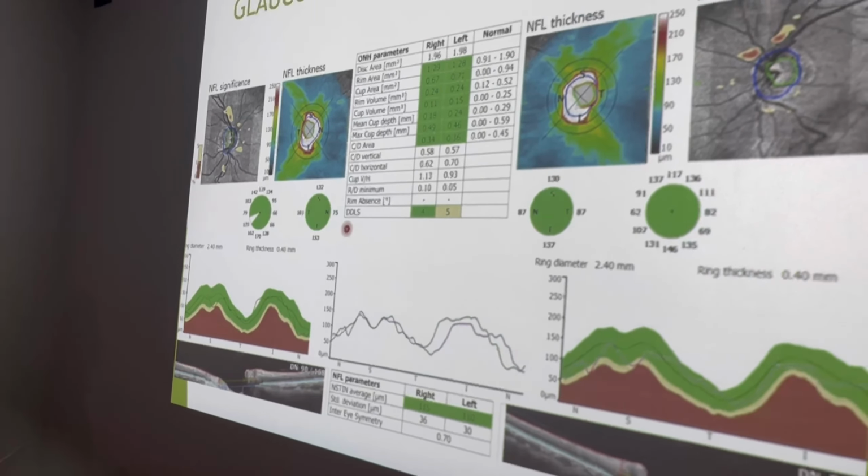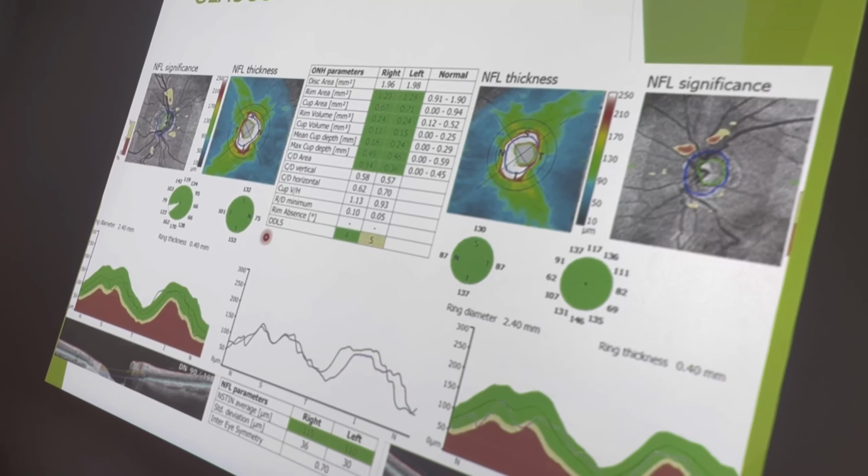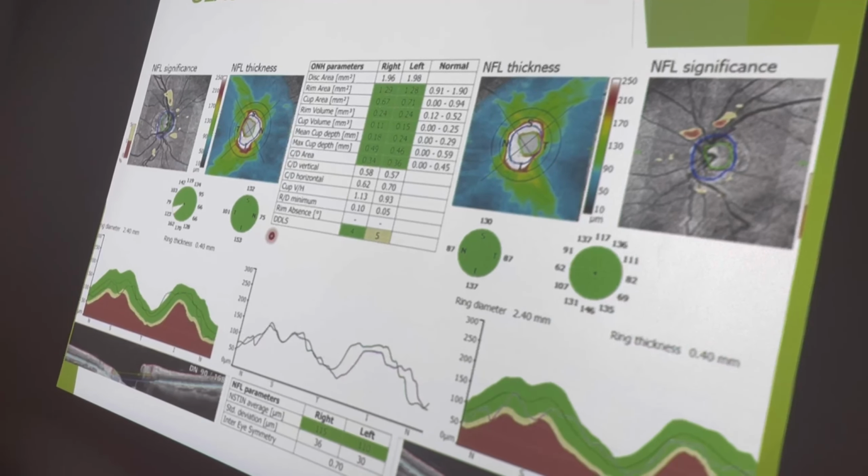In this patient, the patient had high teens IOP, and fields showed some peripheral points but not corresponding to the OCT scan, but the OCT scan showed a minimal early RNFL defect. So to confirm if it is a true defect or machine dependent, we can do a GCC, and in the GCC also, corresponding small defects are present. So this patient is a glaucoma suspect. These patients should be aggressively monitored, observed, and detected early.